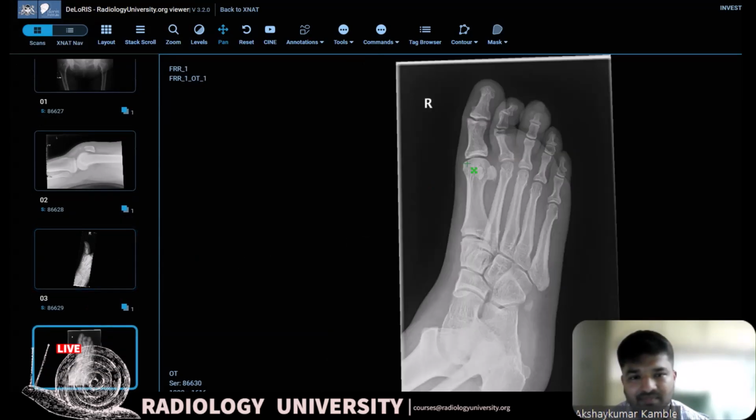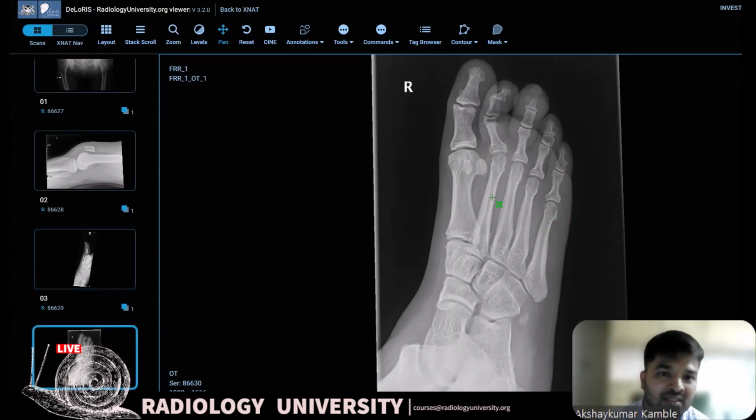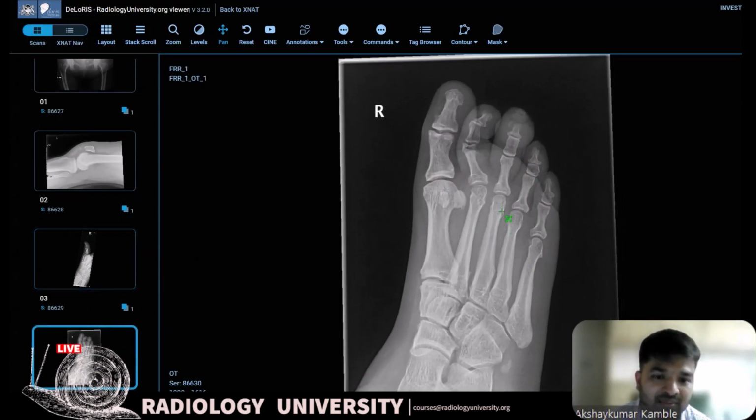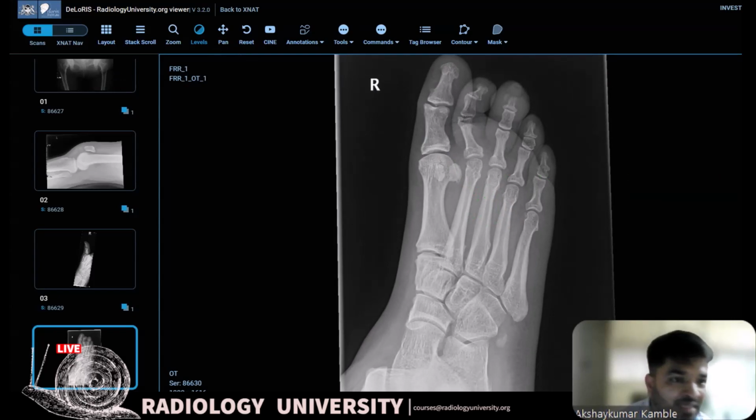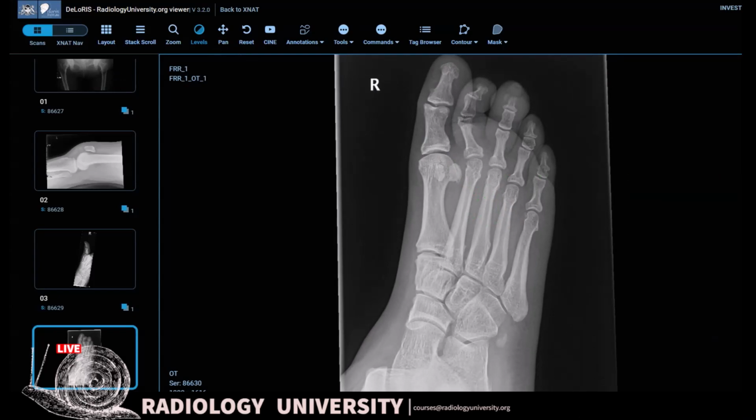So, okay. This one was a bit difficult. Who wants to take it? I think someone else other than Dr. Shankar should try now, and Weisley. Alan, do you want to take it? Catherine, Nidhi, G and K. Does anyone else want to attempt this?